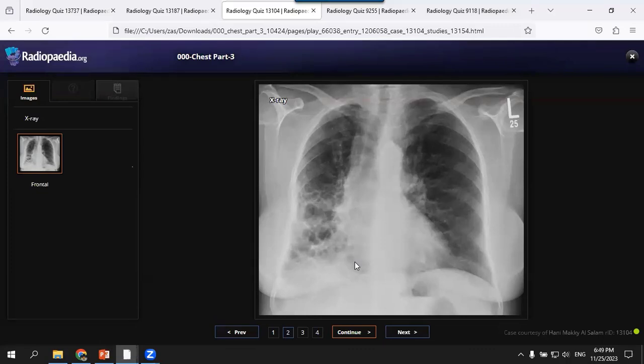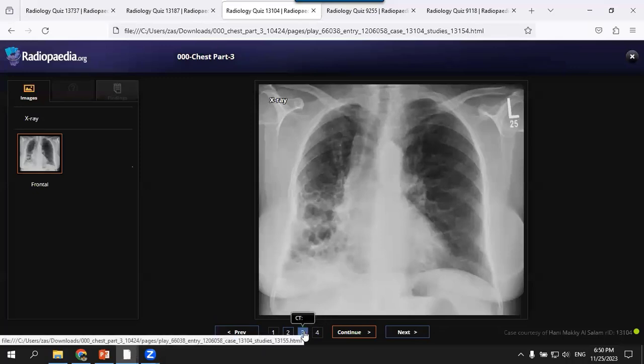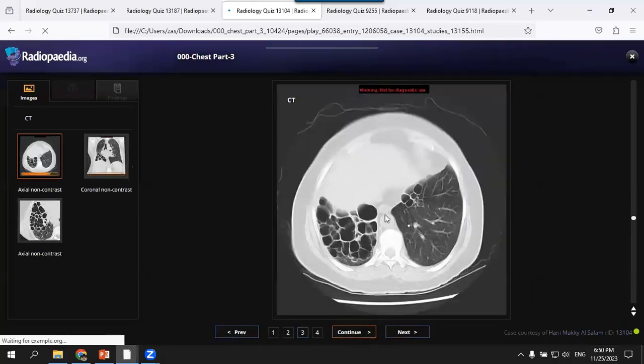Proceed. So this is a frontal chest radiograph of a skeletally mature patient. I can see there is reduced lung volume on the right side. In the right lower lung zone, there are bronchiectatic changes. I can see dilated varicoid bronchi. So isolated bronchiectatic changes in an adult patient usually is post-infectious. So I would like to ask for the history of the patient.